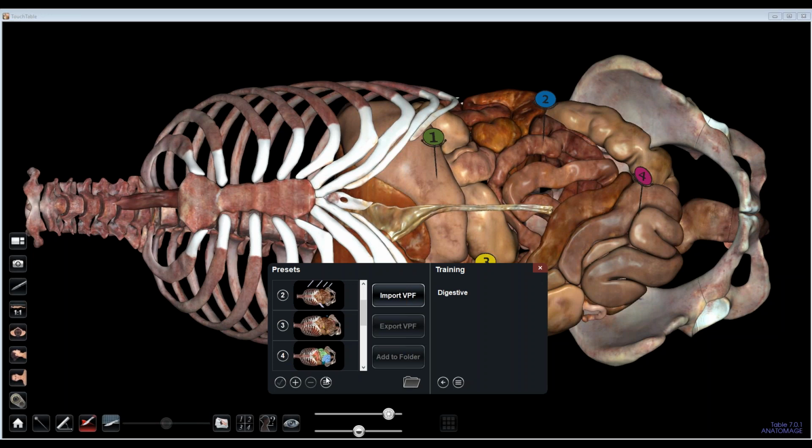You can actually reorder them. So there's a little 3 stacked bars next to the plus minus. You can click that to reorder presets if you'd like. Just click and drag on the right hand side of the image where the 3 bars are.